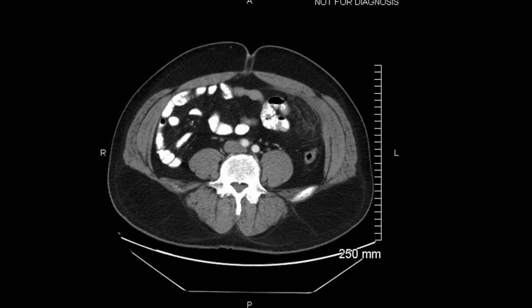Alright, here we are for Radiology Rapid Review Part 2. So essentially what we're going to do, I'm going to go over 3 cases, show you the images, give you about 30 seconds to review the images. After that, we'll go over the relevant findings. So let us begin. Alright, case 1, image 1 of 1.